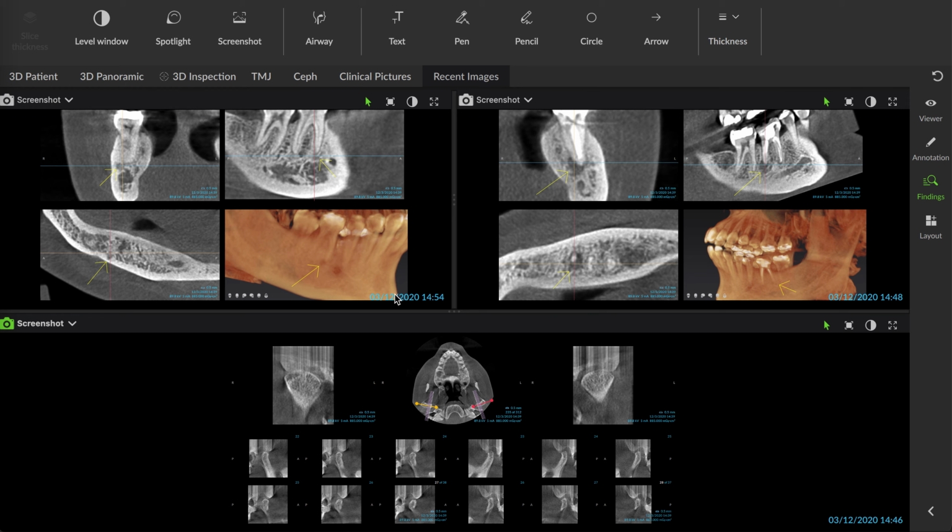This was yesterday. Not sure why that date stamp. It's interesting. The date is yesterday. Well, we'll have to get them to update that. Okay, this is the 3rd of December. Got it. Weird. Wonder if they can reformat that.